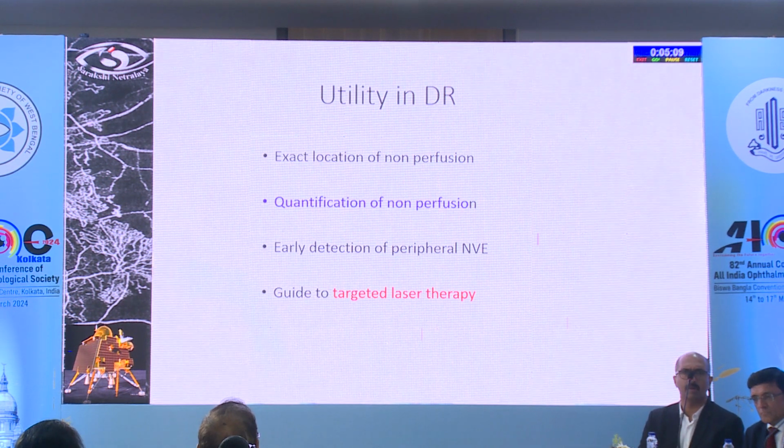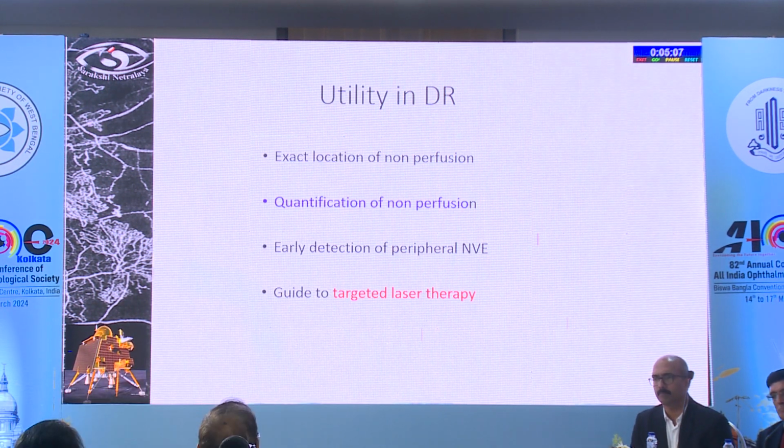Now coming to a few more, Dr. Ajay has already shown you the utility of the imaging system in diabetic retinopathy. It helps you in detecting especially the peripheral neovascularization, and it helps you in doing targeted laser therapy. This is specifically important when you are dealing with a resistant case of diabetic macular edema.